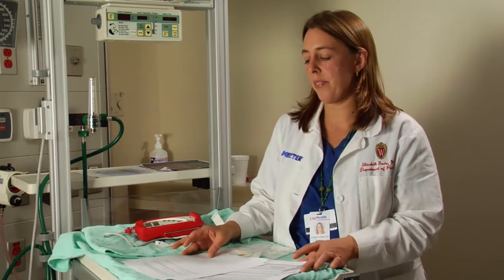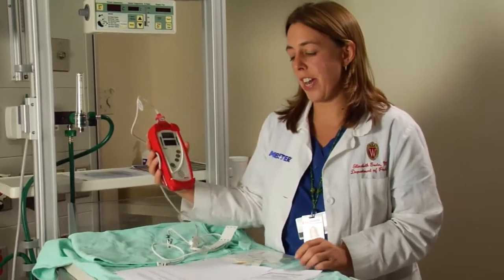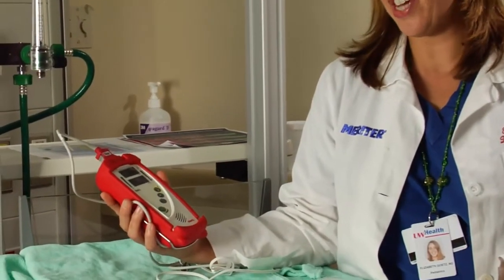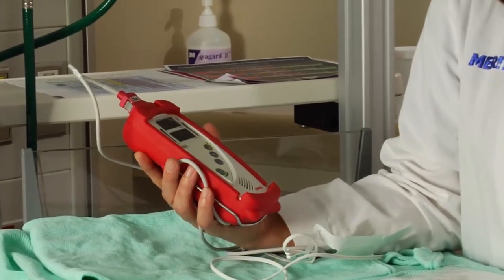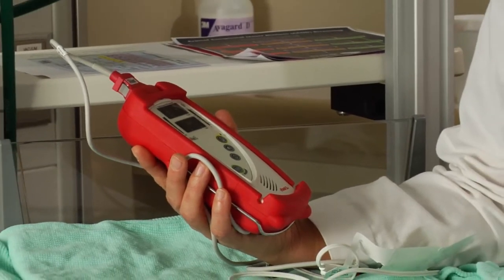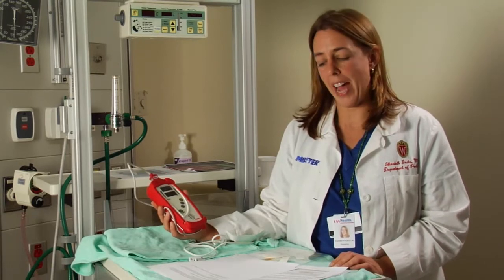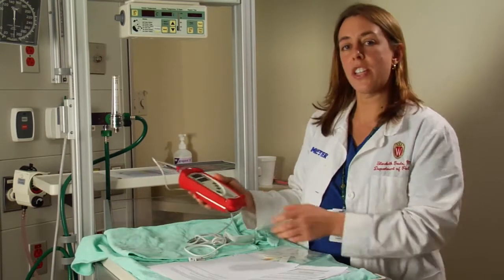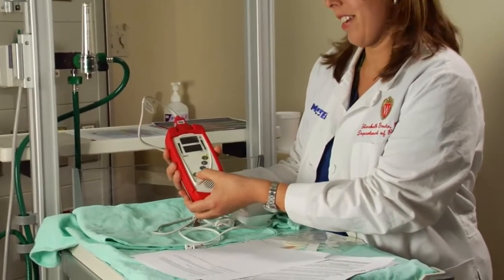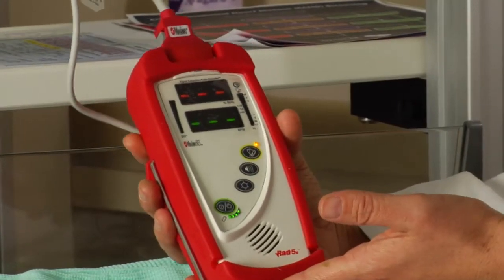a specific pulse oximeter. The most commonly used pulse oximeter in the Wisconsin Shine project will be the Masimo Rad-5. Other oximeters that meet specifications of being approved for use in neonates and able to provide accurate readings with low perfusion and motion are also acceptable. The Rad-5 is easy to use and runs on AA batteries. Important things to know about this oximeter are the power button, which is circled with green. That will turn it on, and this is going to have some beeping.